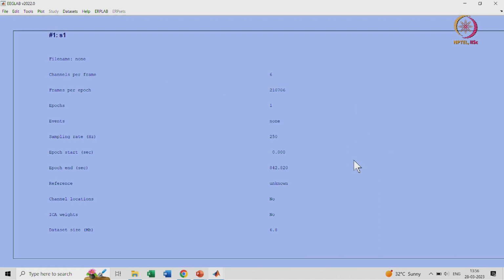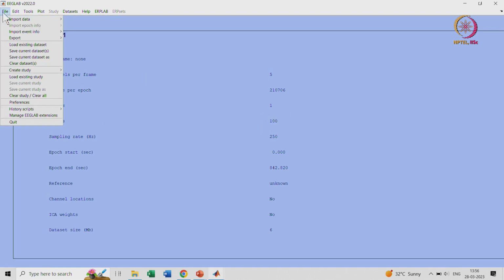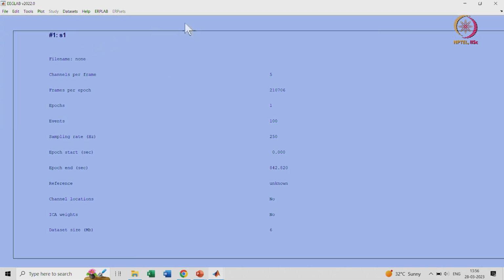I am adding this particular event. Now this channel from frame will change to 5, because we have extracted the event information out of it, and now this is 5. Also you can see 100 events have been added, so that 6th channel had 100 events in between. Same thing we will do for the 5th channel as well.